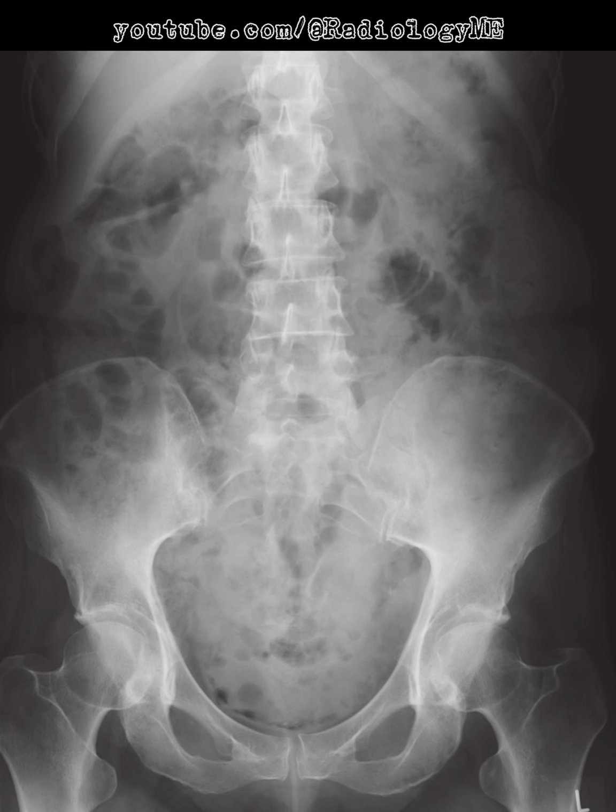On this abdominal radiograph of a skeletally mature patient, the bowel gas pattern appears unremarkable with no evidence of pneumoperitoneum. However, there is a crescent of gas evident in the right hemipelvis, with additional locules of gas in the left hemipelvis. These gas patterns do not appear to lie within the bowel, which suggests that they are projected over the bladder. Given the location and appearance of the gas, this raises concern for the presence of gas within the bladder wall, potentially indicating a serious pathology.